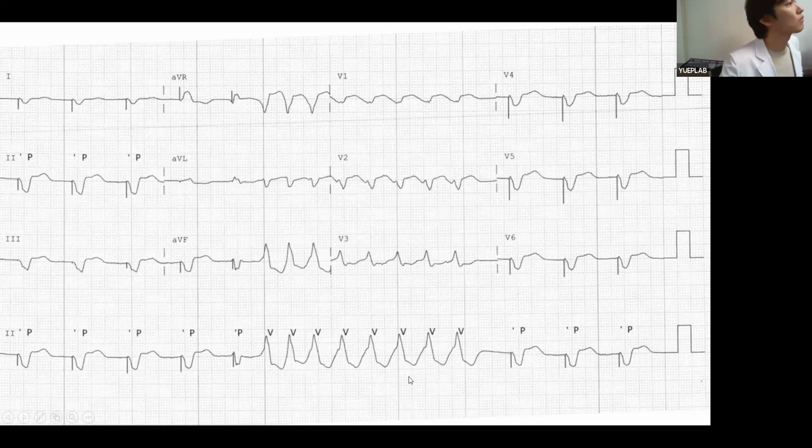And the point is it could be a dissociated P wave, but it is a short period, and I cannot see any P wave in the other ECG. So I don't know whether this patient's baseline atrial rhythm is atrial fibrillation or a real, hidden, very small P wave. But the probability of VT might be higher.